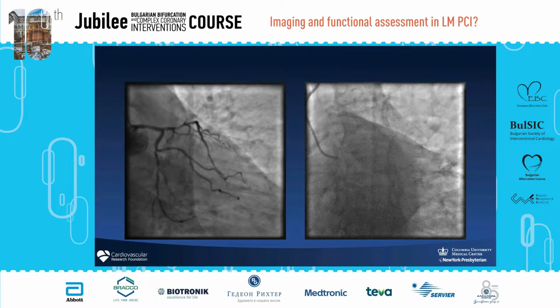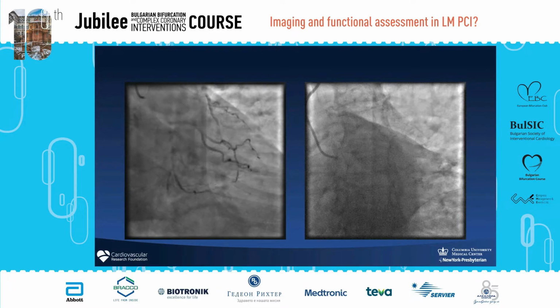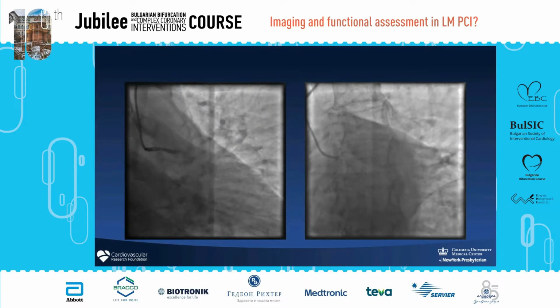Let me start this picture. So what do you think in terms of the left main disease as well as the proximal LAD?